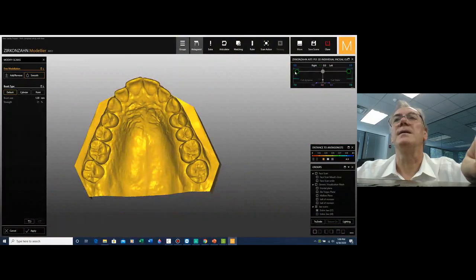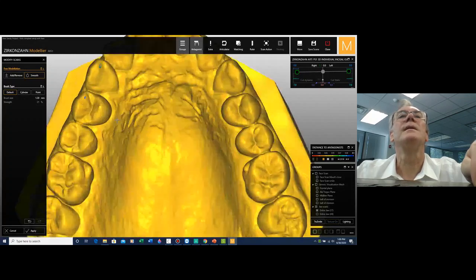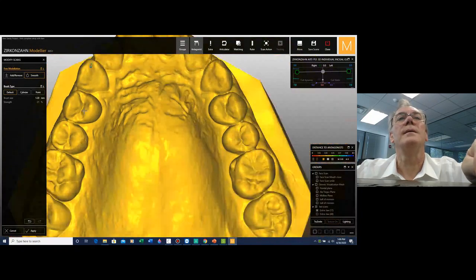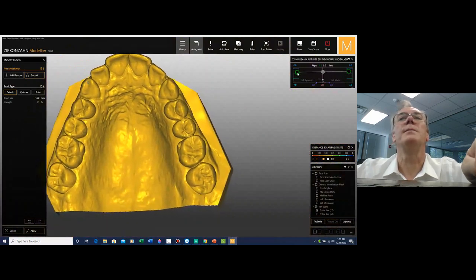Okay, I think that there's nothing else that relates to that movement, there's still something here. I'm good with the movement. Perfect.